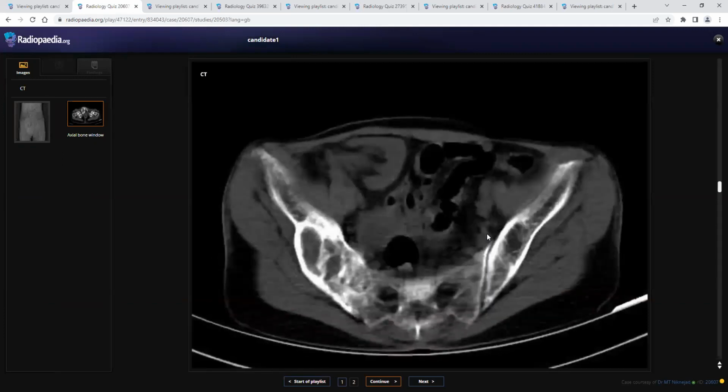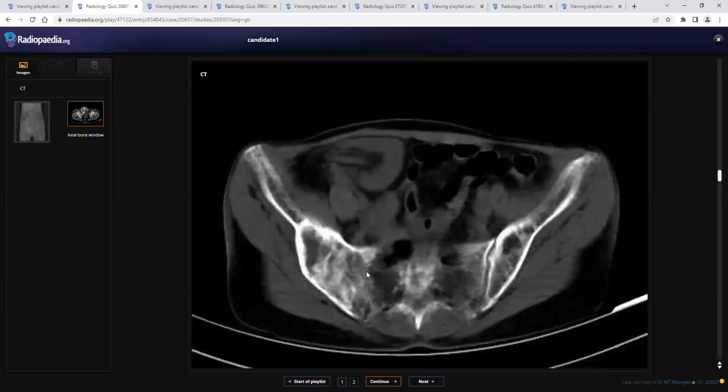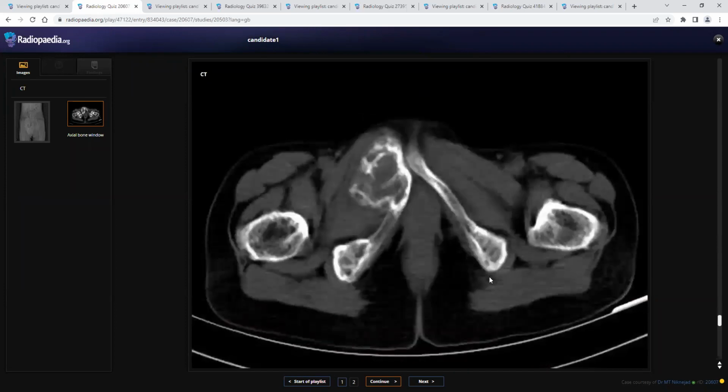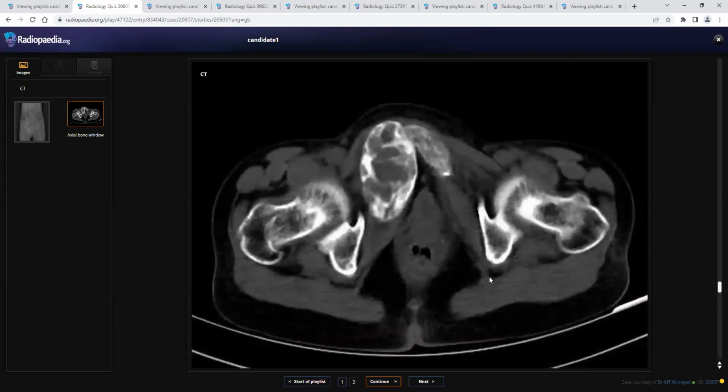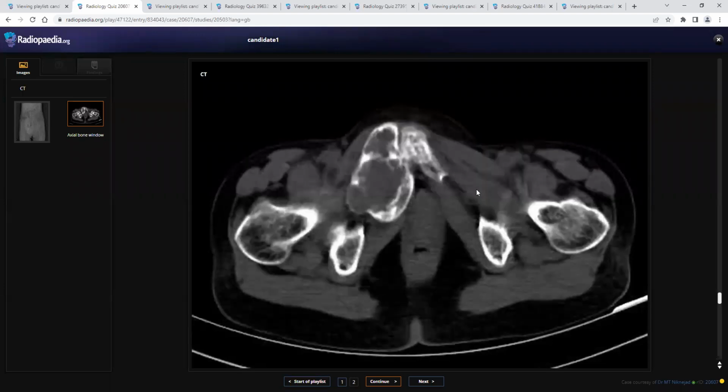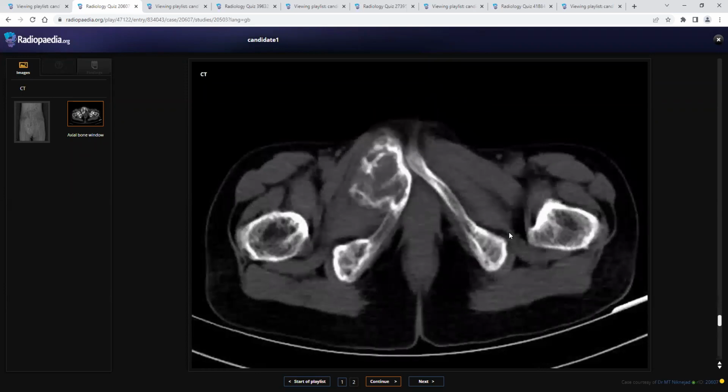This is a case of a transplant kidney in a chronic CKD patient, with multiple expansile lucent lesions with a narrow zone of transition. Again, bone tumors are a favorite for FRCR examiners, and CKD is also a favorite, with all kinds of hemodialysis catheters, and X-rays showing hyperparathyroidism, including erosions of the clavicular ends and the rugger jersey spine. Those things can be kept in the exam also.